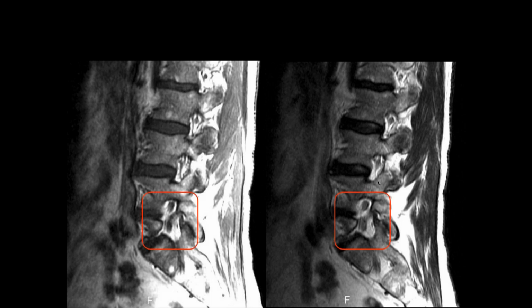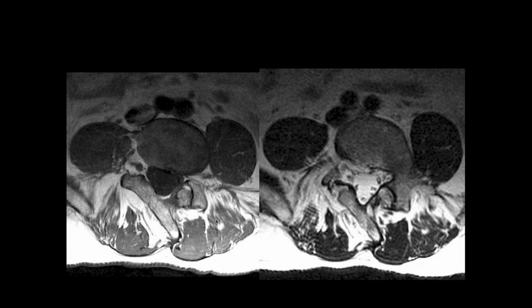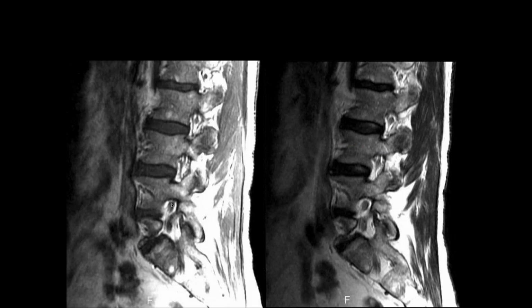Well, so we're at the edges. So we're looking at this area here, and we see two nerve roots. We see a disc here, but we're missing a pedicle. So this is actually a congenital absence of the pedicle. And if you go back, all this asymmetry back here is actually due to the anomaly. And you'll occasionally see this, where you just have a lack of a pedicle, and therefore two nerve roots coming out of a very enlarged foramen.